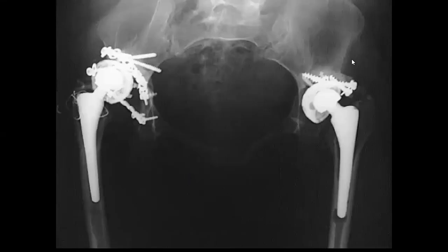When you find the prosthesis or any metallic, you will think about another checklist, including the normal or regular checklist that you are going to check about the cortex, soft tissues, joints, one by one, okay?